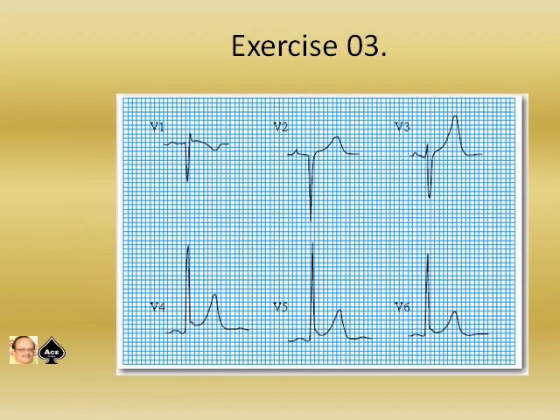This is the exercise for you to see and make a comment and diagnosis. Yes, what does it show? That shows benign early repolarization. Of course, all these ECG recordings should be provided with clinical details also.